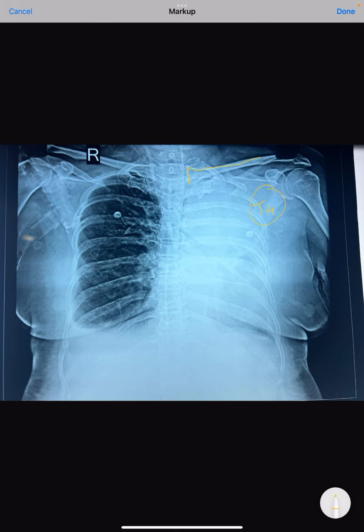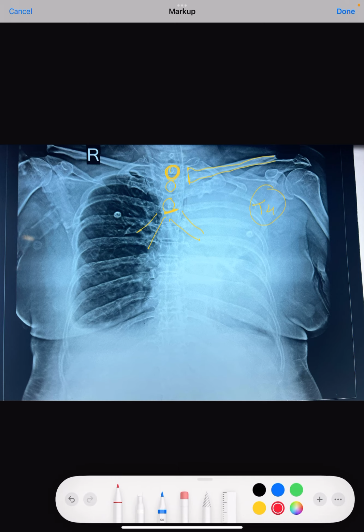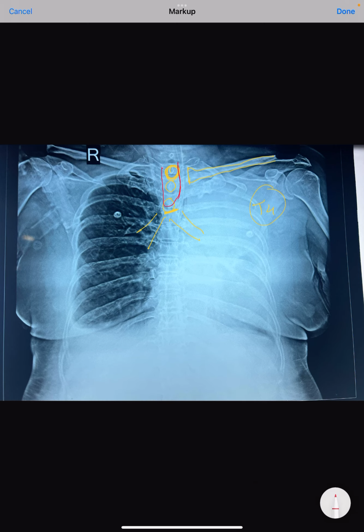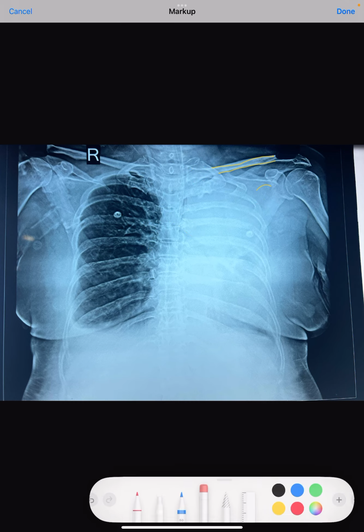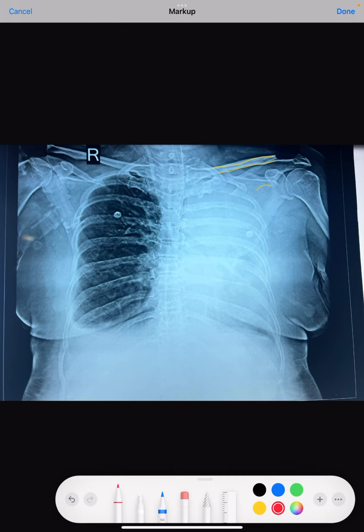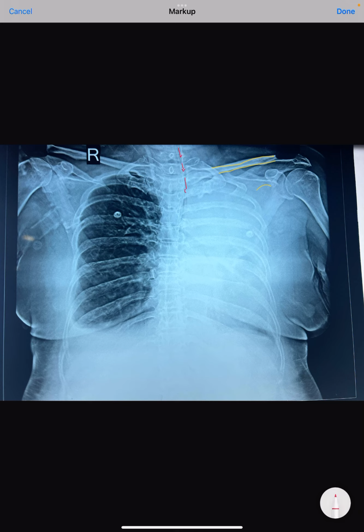At the level of the clavicles, you usually have the T2 vertebra. Below that are T3 and T4. So this is the limit where the trachea bifurcates into the right and left bronchi. That is the reason why we should always put the tube so that it comes up to this level, around 3 to 5 centimeters above the carina. But in this case, what has happened is you can see that the tube has come a long way, up to here.